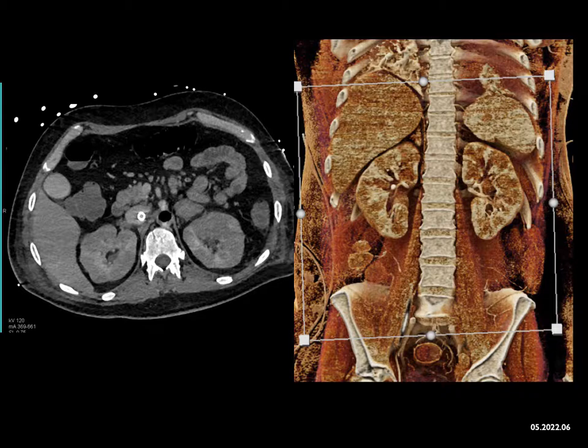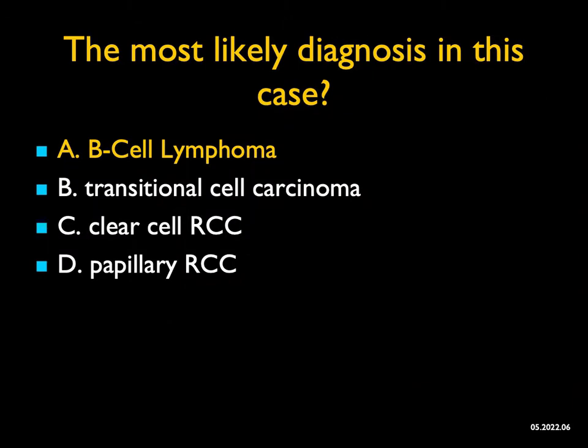It's not likely clear cell or papillary, because whatever process it is, it's going on in both kidneys. With things in both kidneys, you can think of poor perfusion, you can think of infection, you also think of infiltrating processes. This was a patient with B-cell lymphoma. The patient also had involvement of the heart, which caused the patient to go into poor cardiac output. Multi-organ involvement is common with B-cell lymphoma, and this is a typical but beautiful example of infiltration of the patient's kidneys.